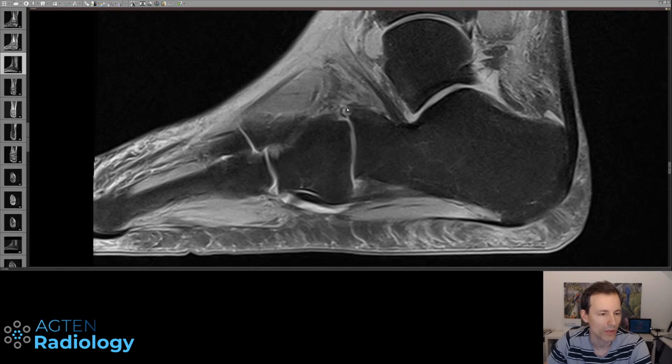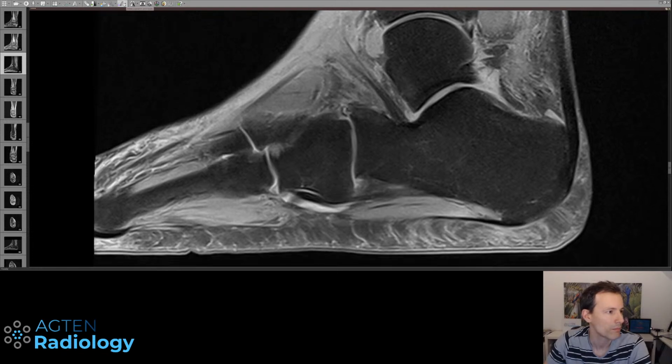So this is something that frequently happens in this kind of distortion of the ankle joint, especially if it's not the normal ankle joint but more the Chopart line that's affected. You always have to be very careful on MR not to miss this, because they can be very subtle, and because it's an avulsion fracture, we typically do not see a lot of bone marrow edema. Bone marrow edema is more a result of compression forces rather than distraction. Let me just pull up my pen here. So this is a tiny fragment here, okay?